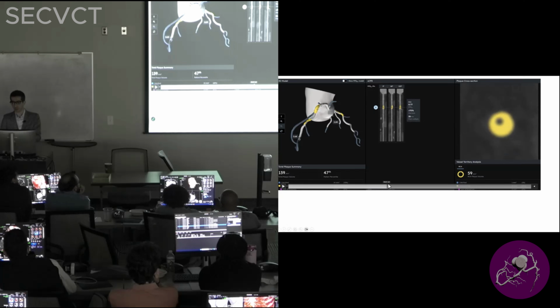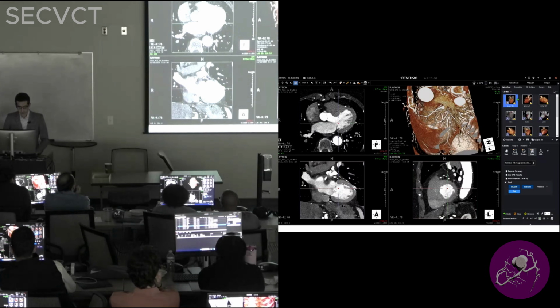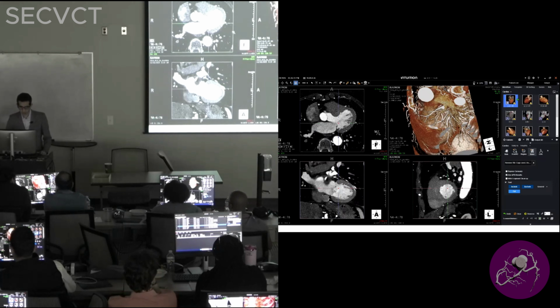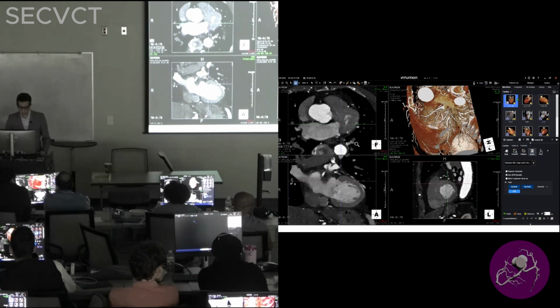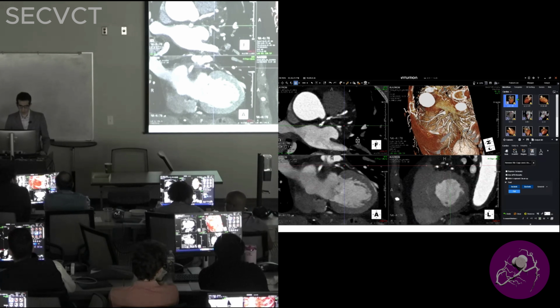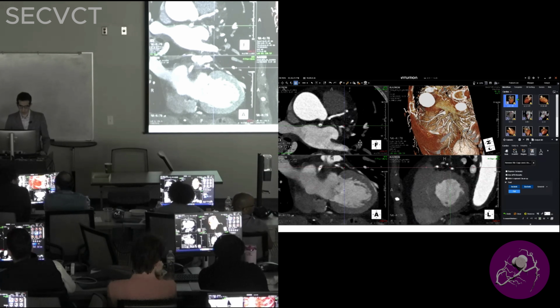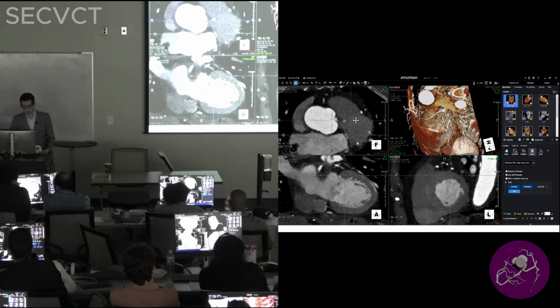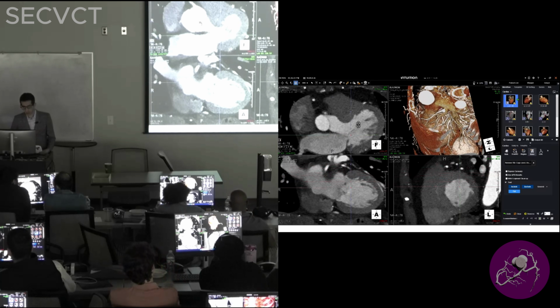We have not looked at the CT yet. I'm sorry, I feel like I jumped. So the question is, is that lesion significant? Let's go to the actual CTA. Let's give you a minute or so to look at the LAD that I already kind of told you about. Again, I'm going to do it the MPR way. We see the lesion and we will double oblique it and understand that lesion. There's some plaque in the LAD. So this is LAD non-obstructive, I would say.